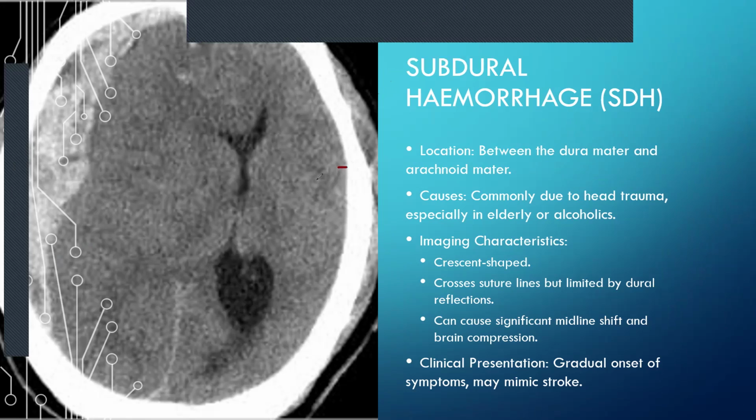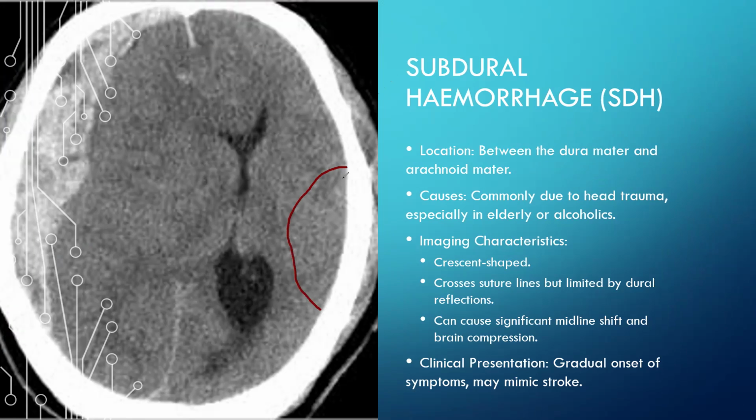So, hopefully we won't kill this patient by doing this. An epidural would have that appearance: you've got that biconvex shape and an acute bright bleed. Your subdural, on the other hand, would have this pancake or crescent shape, because all that's blocking it is the squishy brain tissue in front of it.